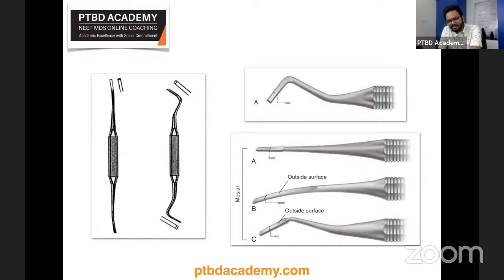The straight chisel has a straight shank and blade with bevel only on one side. Its primary cutting edge is perpendicular to the axis of the handle, so we are omitting the primary edge angle and cutting edge angle. It is similar in design to a carpenter's wood chisel. The shank and blade of the chisel also may be slightly curved. You can see that in illustration B, which is called the Wedelstaedt design, or maybe binangle, that is illustration C.